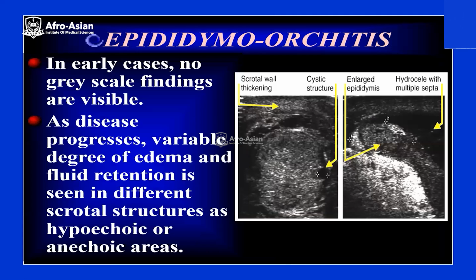The scrotal inflammatory disease includes orchitis, epididymo-orchitis, or just epididymitis. These are the inflammations. Here you can see the epididymis is inflamed.